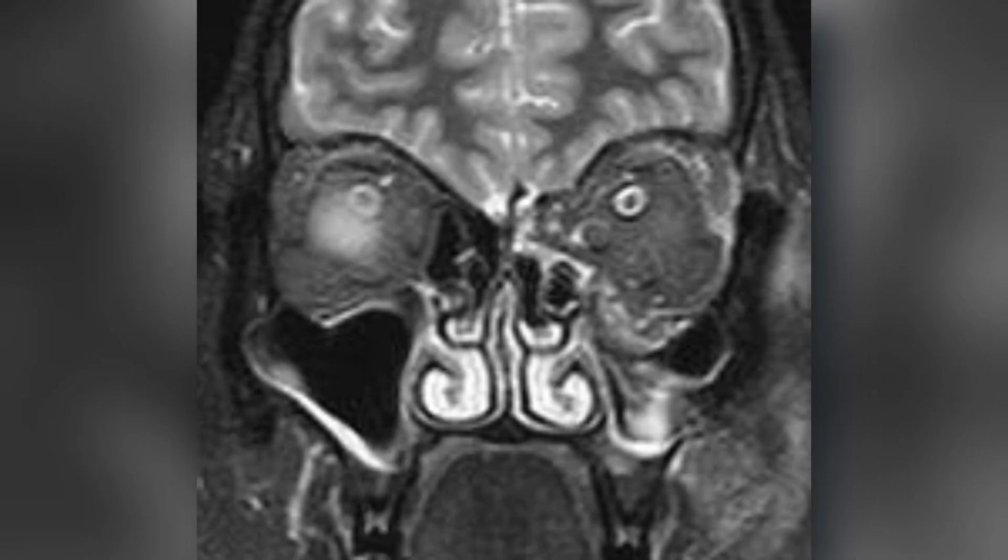Complementary use of MRI may be helpful when CT findings are subtle or when evaluating possible ischemia of entrapped muscle. On MRI, look for edema or increased T2 signal within the muscle, loss of normal muscle architecture, and reduced enhancement post-contrast, all of which suggest compromised vascular supply.